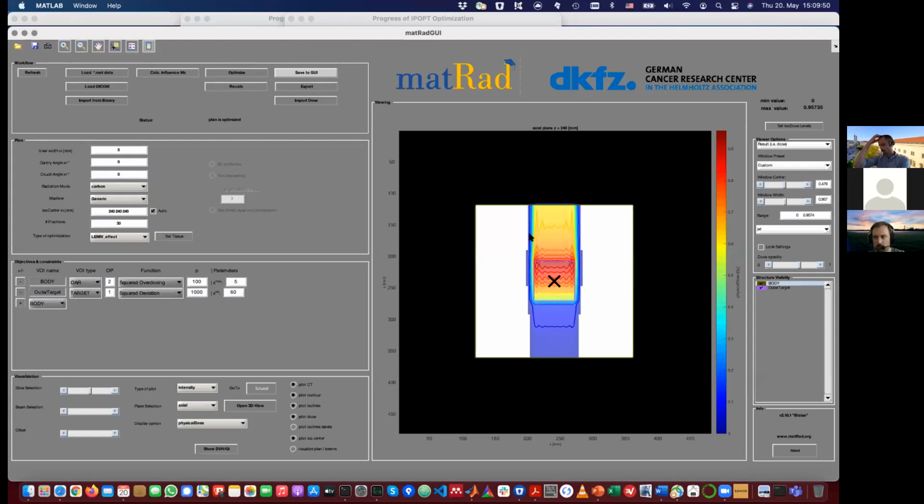And what we're now doing is we switch our tissue type. In this optimization, we were assuming that our tissue is characterized by an alpha beta ratio of 2 in the photon world, because we know this type of tumor very well, and according to a couple of cell experiments we know that the radiosensitivity can be described by the linear quadratic model with an alpha beta ratio of 2 very well.